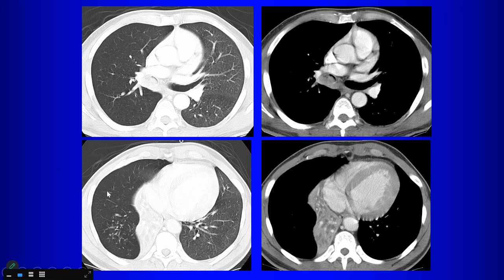When we compare the right lung to the left, notice that the right lung here is more lucent than the left lung because, compensatory, yeah, so there's compensatory hyperinflation. This is all right upper lobe. There's compensatory hyperinflation here of the right upper lobe when we have collapse of the right middle lobe and the right lower lobe. Back to our differential. What is our differential for this? Endobronchial lesion.